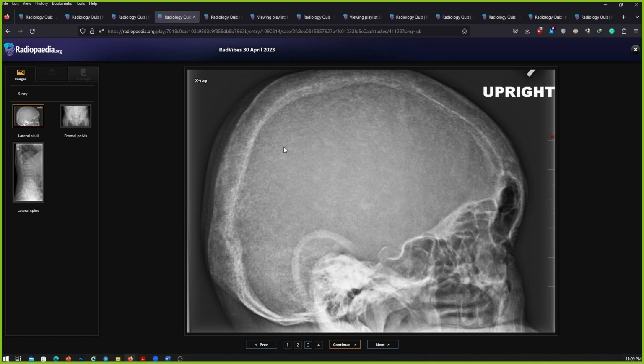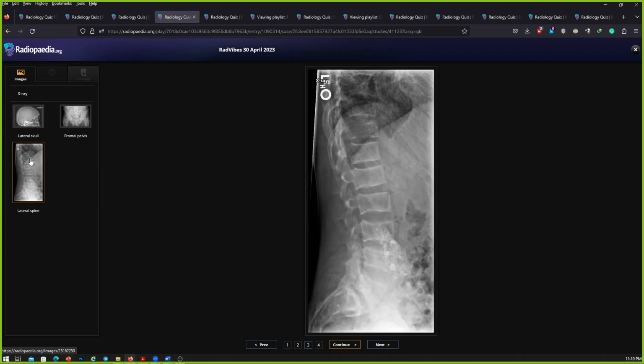Yes. So it's likely to represent secondary hyperparathyroidism to a renal osteodystrophy. And this is the lateral X-ray of the lumbosacral region, which shows a calcified lesion within the pelvis, which resembles the shape of a kidney, which could represent a calcified renal transplant, which is not working, and secondary osteodystrophy.